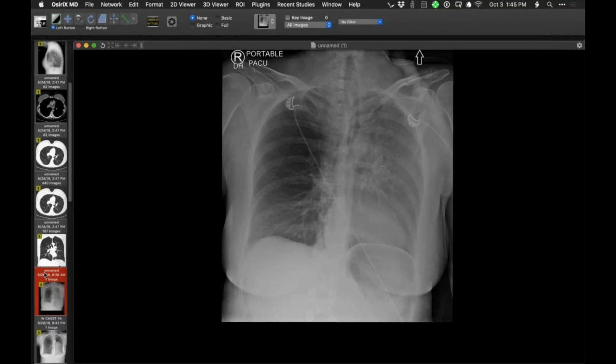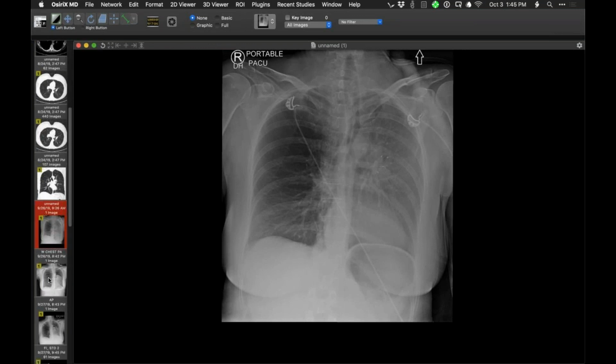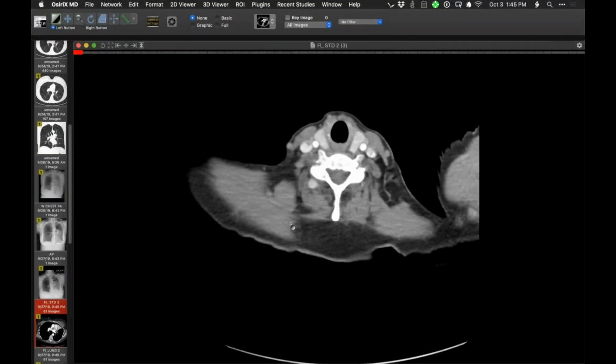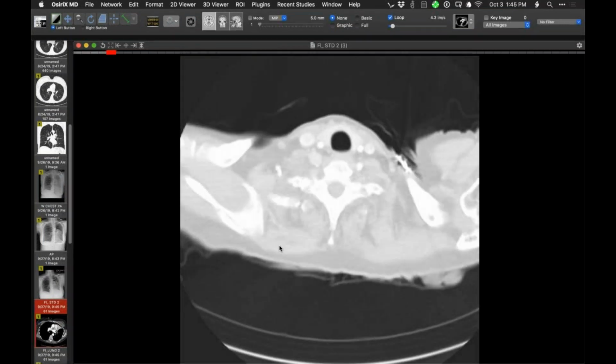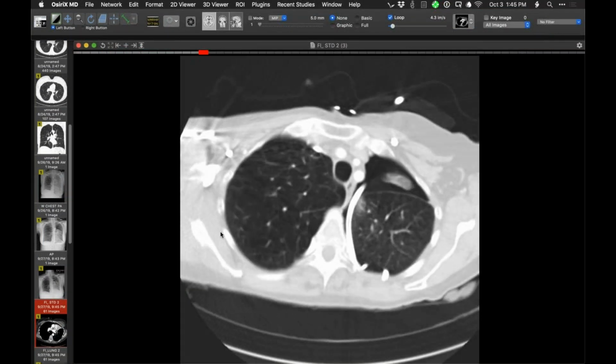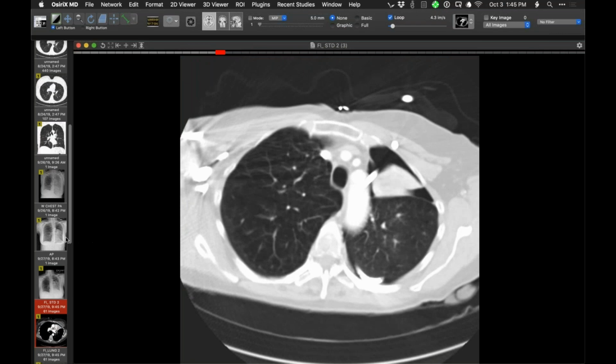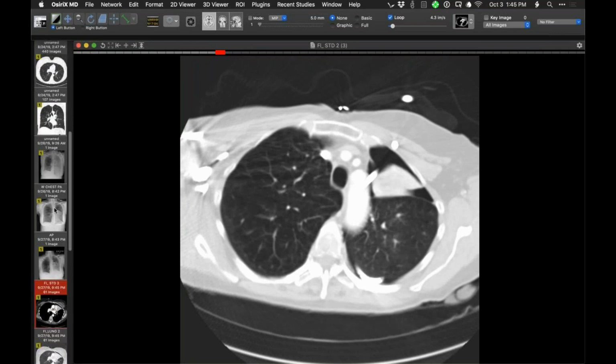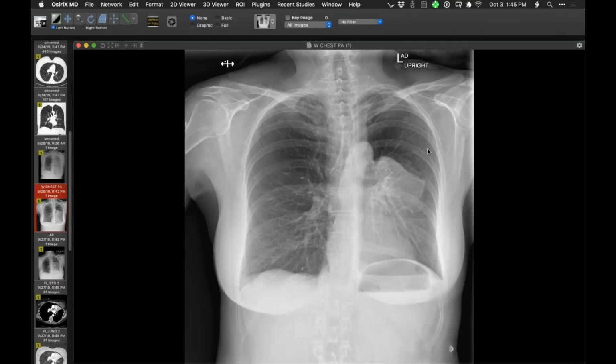Then she was imaged after that, which confirmed that we do in fact have a pneumothorax or pleural gas down here. So that is the 26th. Here's an image from the 20... Let me see if I have one before that one. I'm not sure that I do. Let me just show you another image that we had on the 26th.